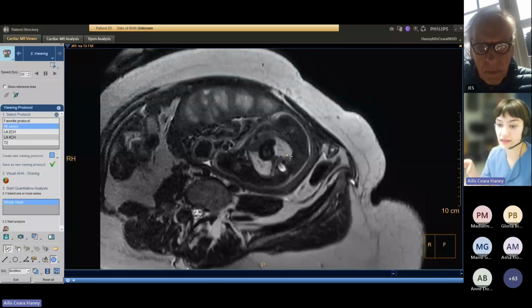And also while doing these exams and while having the patient in the scanner, there's my colleague, Professor Alexander Kovacevic from pediatric cardiology. He was present while we were performing this exam, and Dr. Florian Andre, who is head of cardiac imaging in adult cardiology. So we really analyzed these images together.